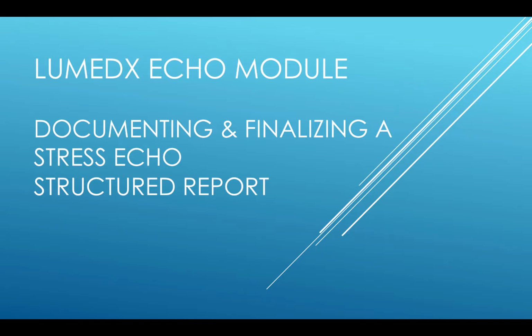Lumedx Echo Module, Documenting and Finalizing a Stress Echo Structured Report.